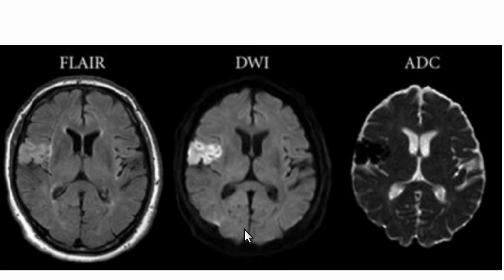Here's a cerebral acute infarct. The main sequence for seeing a cerebral acute infarct is DWI. DWI is diffusion-weighted imaging, okay? ADC is just a counterbalance check for DWI to tell you how acute it is, how recent it is. DWI becomes positive immediately after a stroke. Infarct is the medical word for stroke. And then ADC has low signal, hypointensity. And when you have hypointensity on ADC, that's called diffusion restriction.